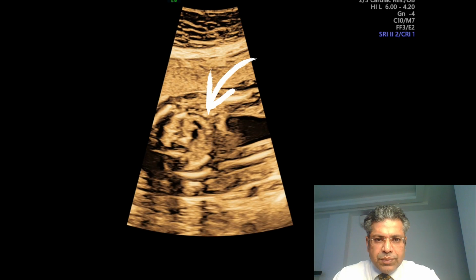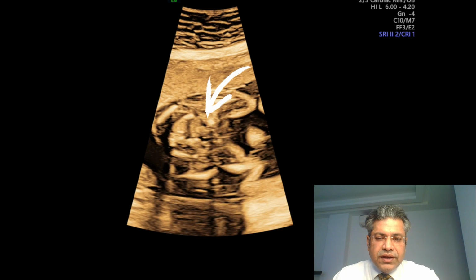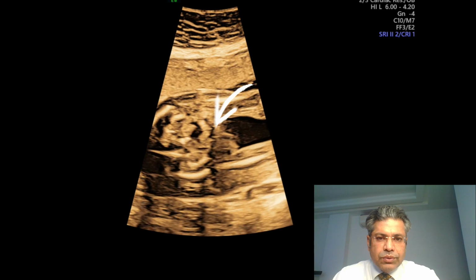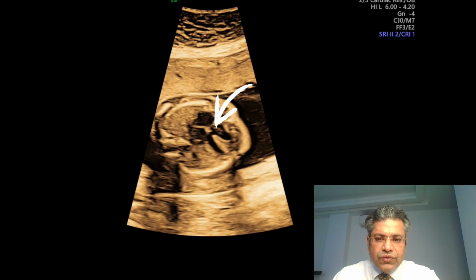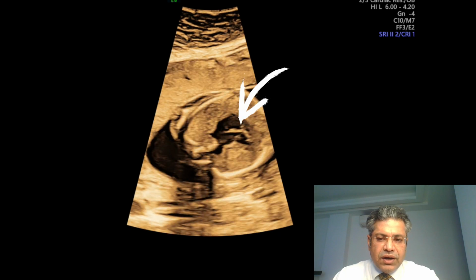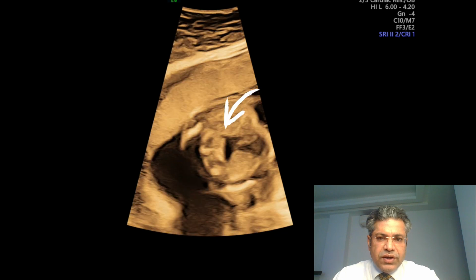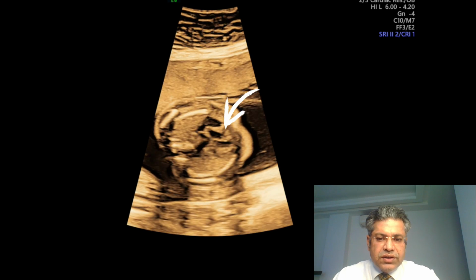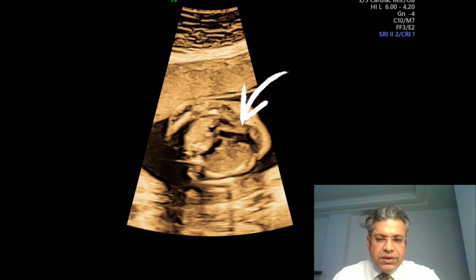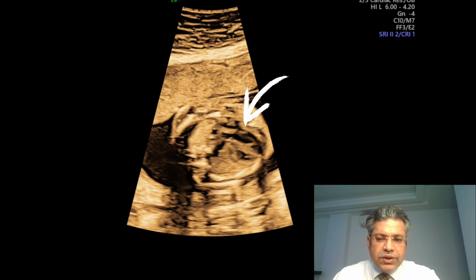Secondly, we identify that the pulmonary trunk is absolutely normal. The division to both the RPA and the LPA is also normal. But you see that the aortic root is dilated and the arch of aorta is slightly dilated, right? So this is the dilatation. Then we try to look around why it is dilated, and we see that there is an aortic override, meaning thereby that the RV is also contributing to the aorta. Usually the RV-LV ratio is 60-40, but in our case it is slightly reversed, meaning thereby that the RV could be slightly small. So that is how it is.